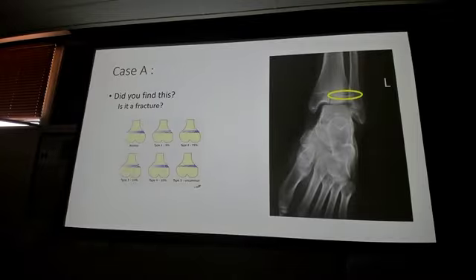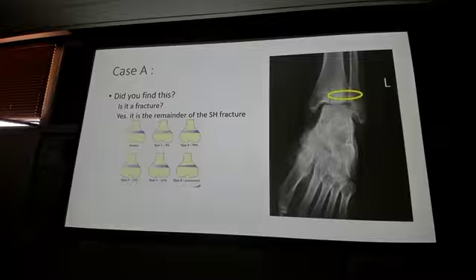What's that? Growth plates. Oh. But don't feel bad about that, because that is the physis, that is the growth plate. But look at the picture. Where does the fracture go? It goes through the physis and through the epiphysis, right? The energy had to come out and go somewhere. So technically it's part of the fracture. Now the good part is you don't need that to get to a Salter-Harris 3.